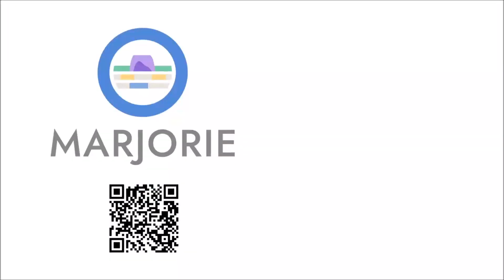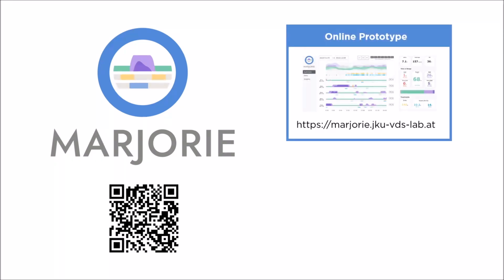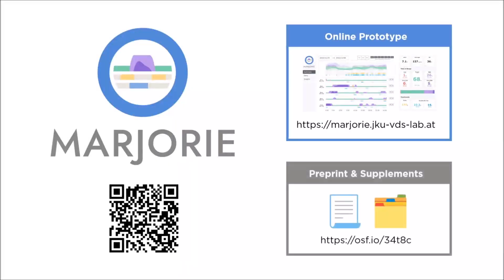And that's it for Marjorie, our visual analytics solution which helps patients and doctors find and analyze patterns in type 1 diabetes data. You can try out an online prototype of Marjorie with a preloaded dataset under this link, and you can find our paper and all supplemental materials under the following link.